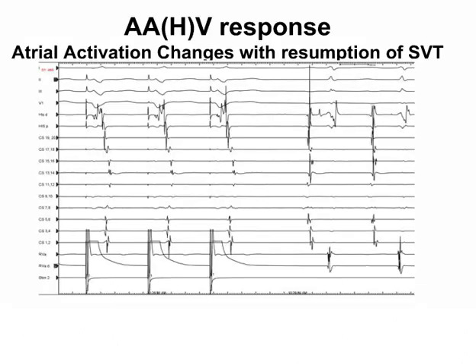We look for certain things with pacing during tachycardia. We look for an AAHV response or an AHV response. This is typical for atrial tachycardia if you're able to get through the AV node. The truth is, for most atrial tachycardia, when you pace, you get retrograde conduction block, so you get dissociation. That's the more frequent finding with AT.